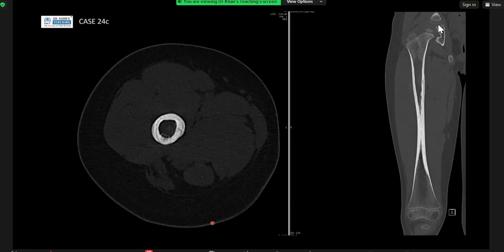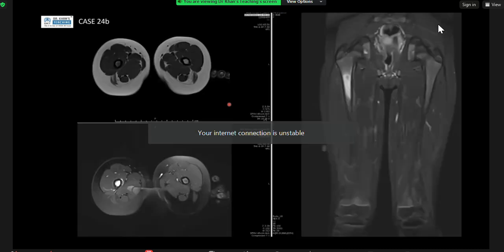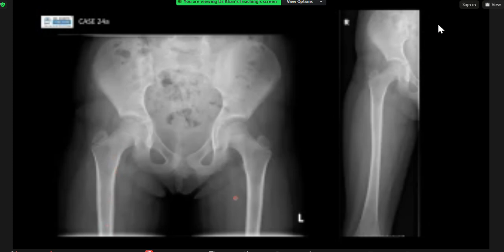Okay, so I see where you're going with that. Let me just go back. I think we mentioned the periosteal reaction here. Not much in the way of lytic or bony destruction or osteopenia. The bone densities look quite similar apart from that periosteal reaction that we can see.